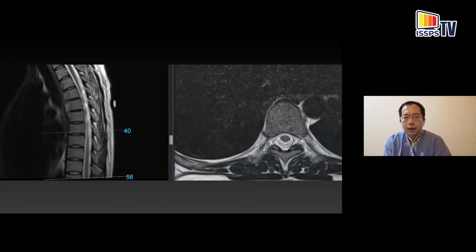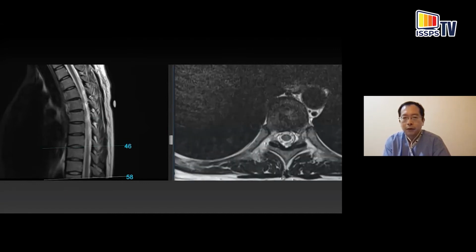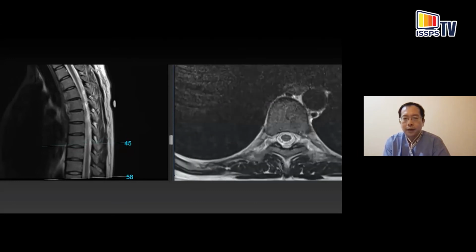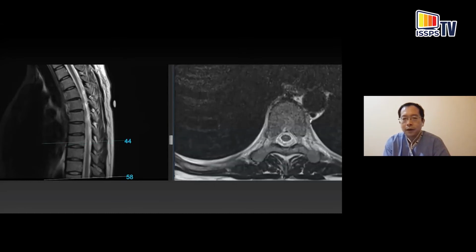Scanning downwards again, this is T7, T8. This is the mid-thoracic spine level. So there is some space, but because of all the overlap, the amount of clearance that you have from the inferior aspect of the transverse process to the next rib is much less. You can see that in the upper spine, when I was scrolling, we still had 1 or 2 slices from the inferior aspect of the transverse process to the rib.